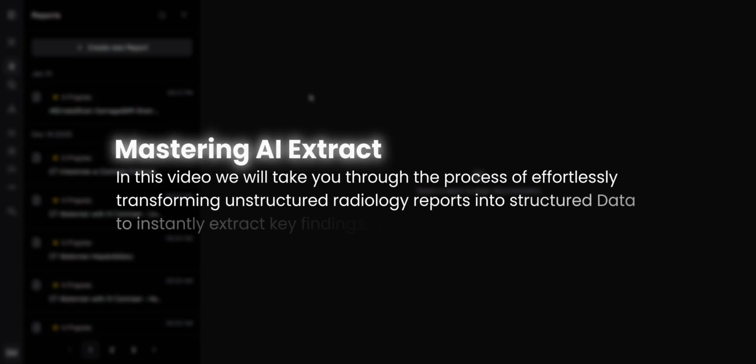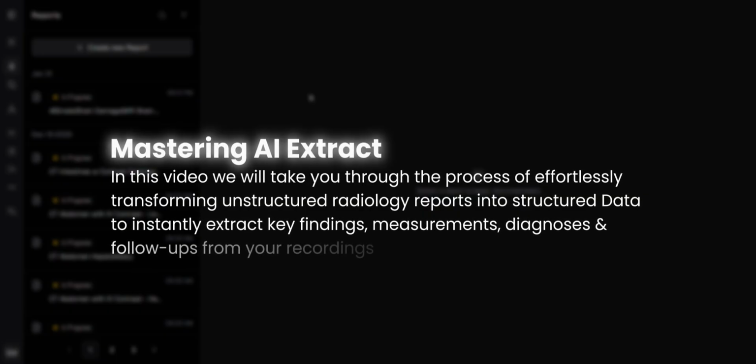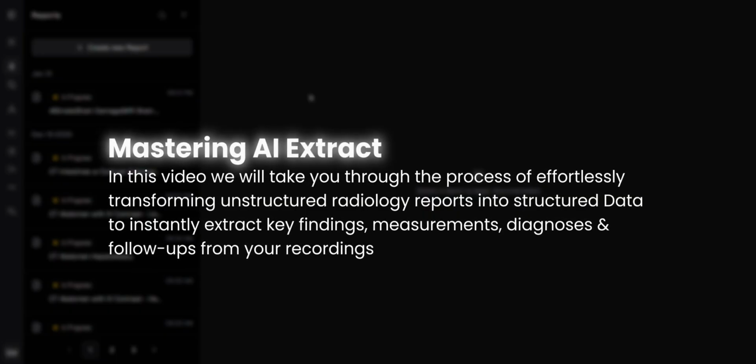Mastering AI Extract. In this video, we will take you through the process of effortlessly transforming unstructured radiology reports into structured data to instantly extract key findings, measurements, diagnoses, and follow-ups from your recordings.